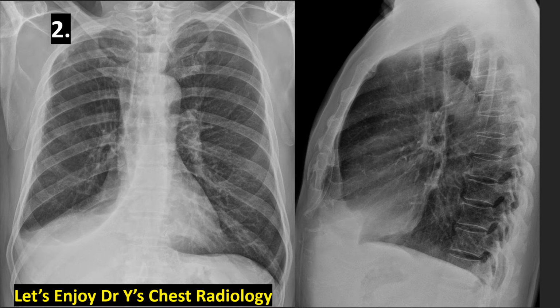We see only one diaphragm, the left diaphragm, on the lateral film, and an obscured, slanting image of the right hemidiaphragm. What made the difference between chest case number 1 and number 2?